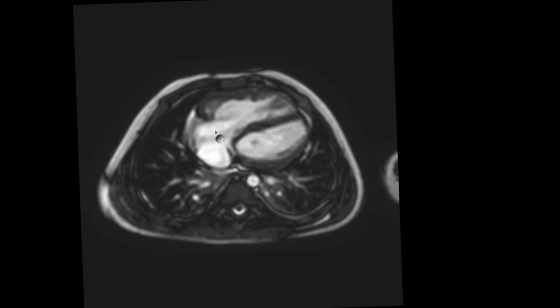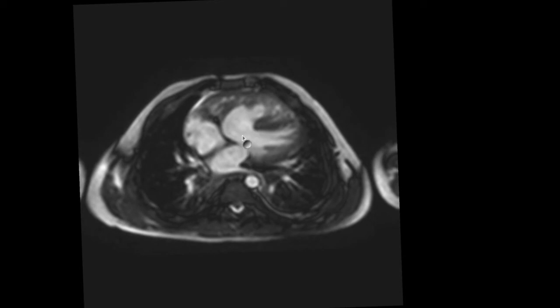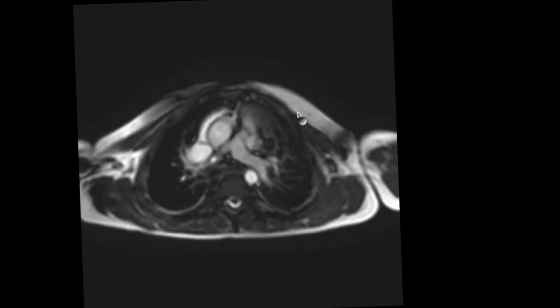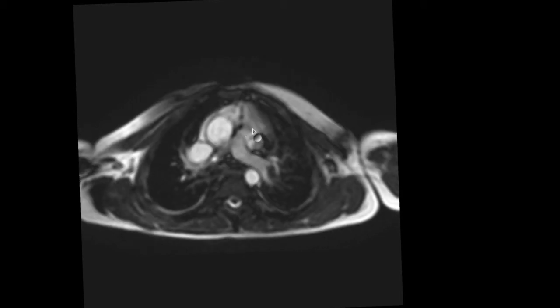Then the right atrium drains into the right ventricle. I can see some hypertrophy of the RV myocardium. I can see that there is a ventricular septal defect. So this is the RV cavity, this is the LV cavity, and this is the VSD. And from the RV, this is the RVOT. There is muscle hypertrophy in the RVOT and there is significant narrowing. This is the MPA. MPA appears small in size and there is significant pulmonary stenosis. The MPA further bifurcates into the LPA and the RPA over here.